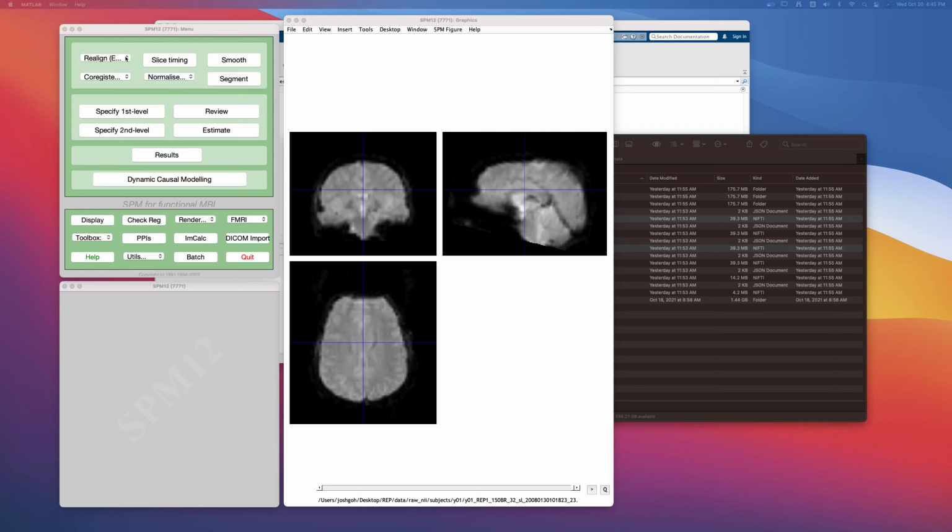All right. So the motion correction tool is located here in the menu, and we notice there is the estimate, and reslice options, and then the realign and unwarp. As we talked about in class, because we do not have the unwarping gradient field images, we're going to ignore that for the purposes of this course. We're going to focus on estimate, reslice, and estimate and reslice.